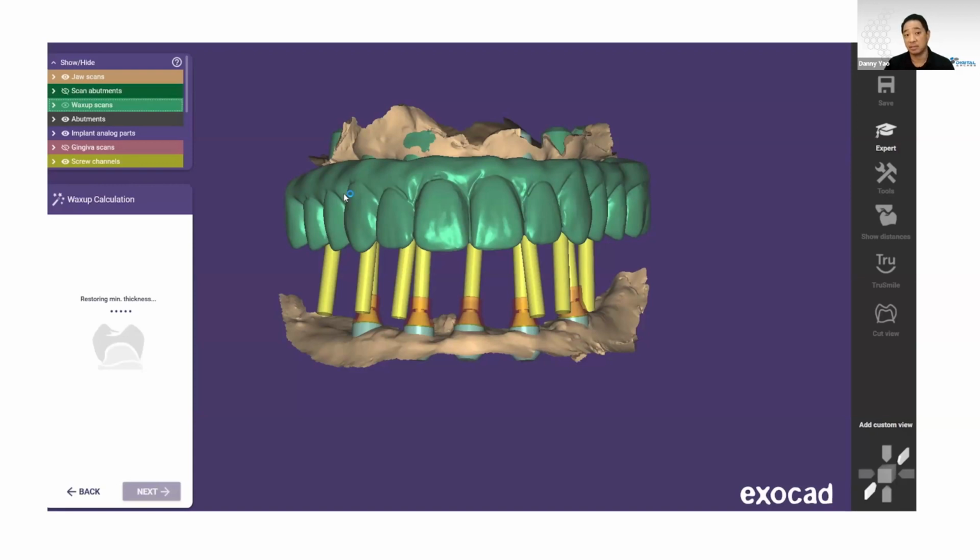So really, that's what I wanted to go over with you guys today. This is just going through a calculation on the slow computer that we did it on, so it's going to take a long time. But at the end, it just inserts all the screw holes and things like that into the prosthesis. Normally, you would be doing this maybe on a bar or something like that. But yeah, it makes it so you have everything you need for that day.